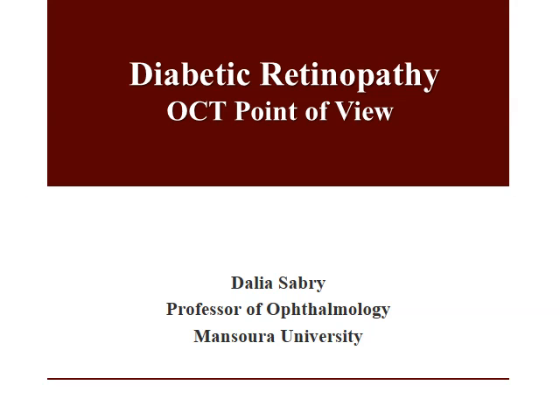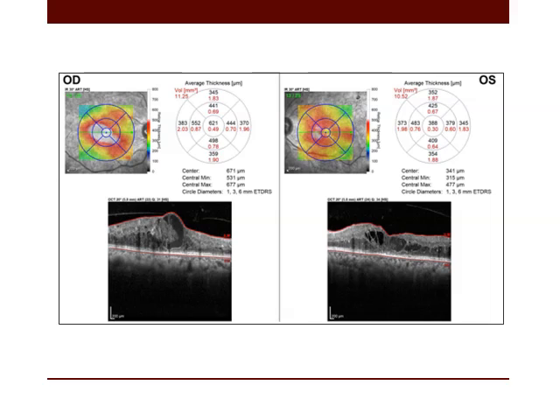Bismillah ar-Rahman ar-Rahim. Diabetic retinopathy, OCT point of view. The most important scan to obtain in a diabetic patient is the volumetric 3D macular scan.